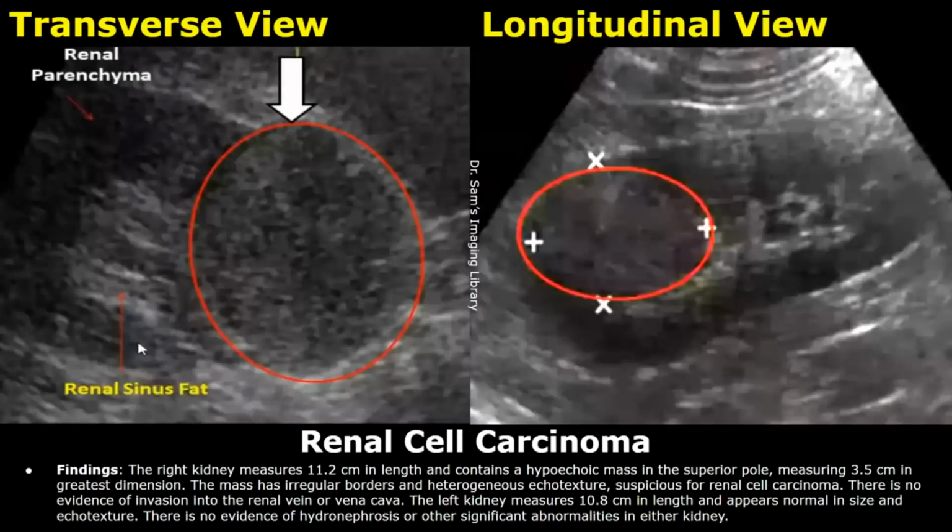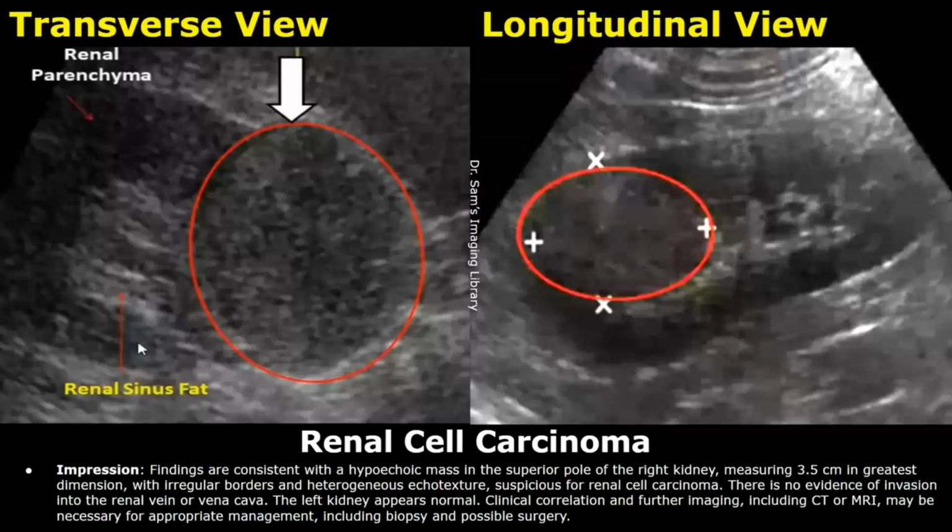These findings are written in the impression. The hypoechoic mass with irregular borders and heterogeneous echo texture. These findings are suspicious for renal cell carcinoma.